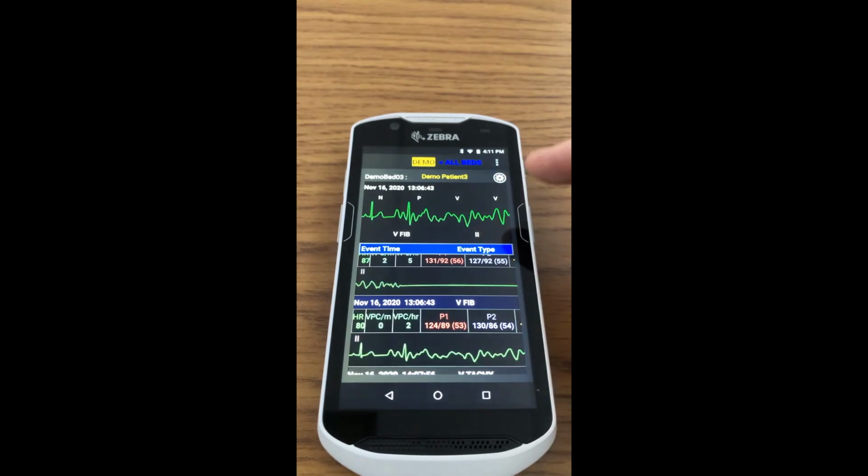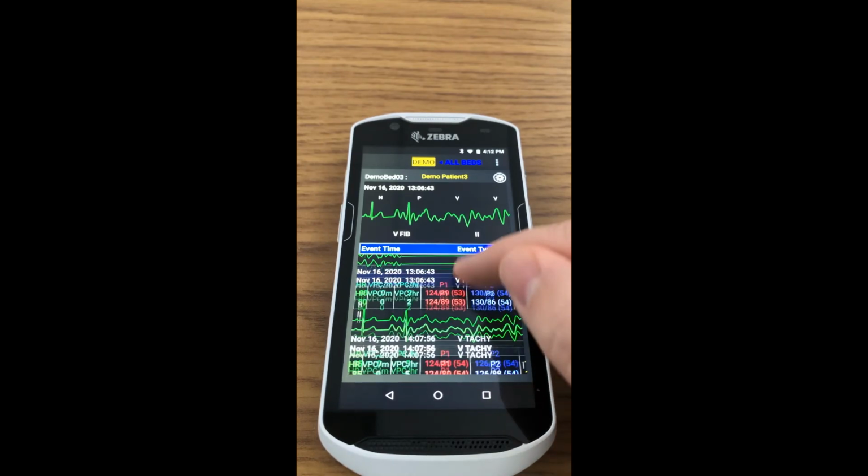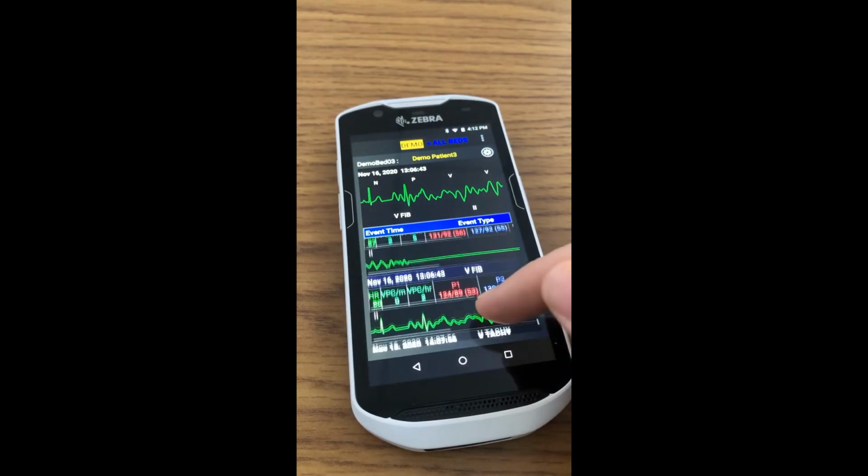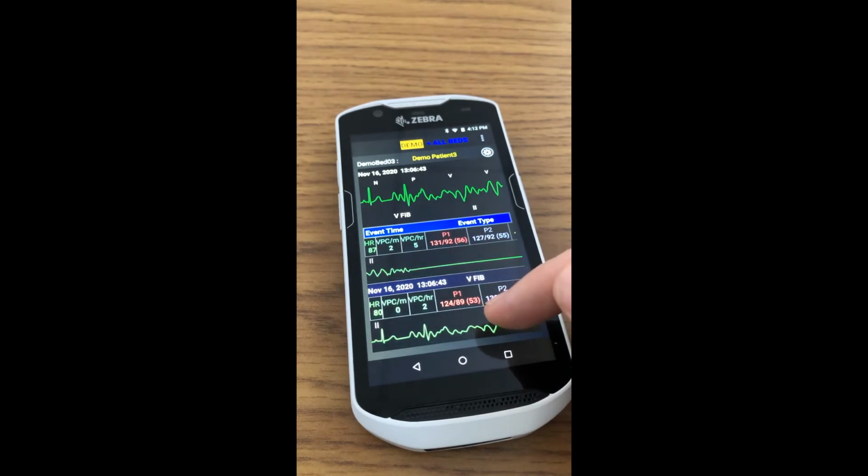An arrhythmia recall file is created so that the detected arrhythmia is displayed in the center of the recall waveform. The arrhythmia recall files list can be scrolled by swiping up or down in the area where the files are displayed. A more detailed view of the arrhythmia recall files list can be viewed by tapping the preview waveform.